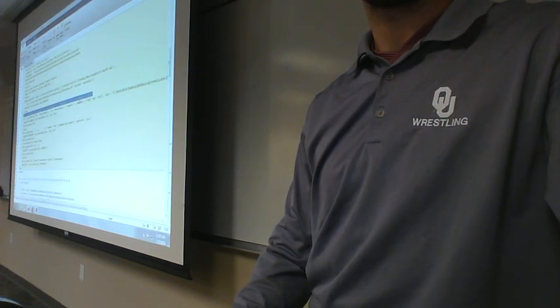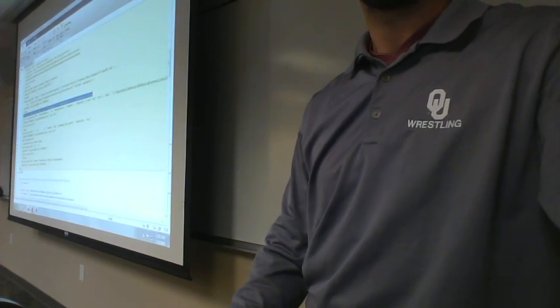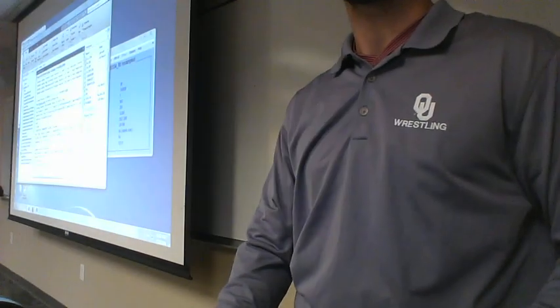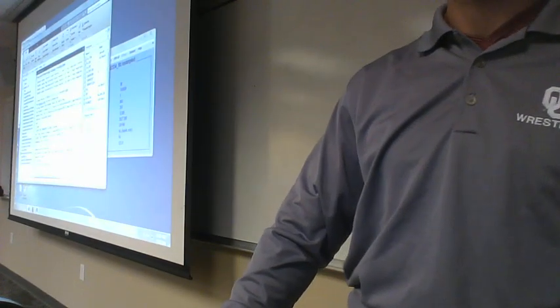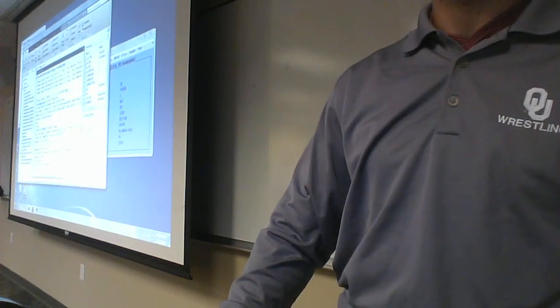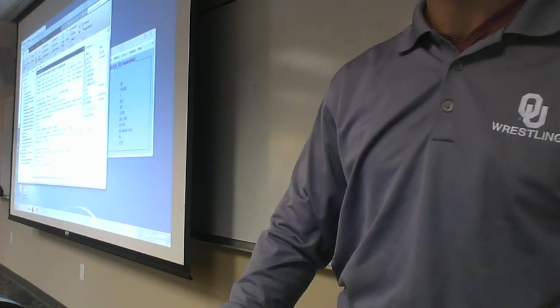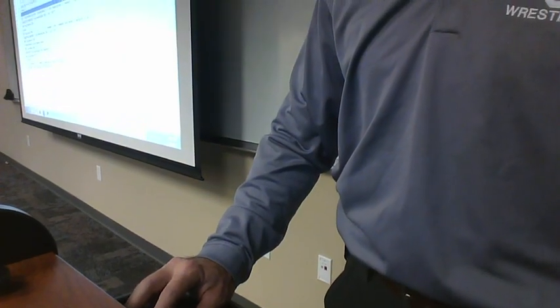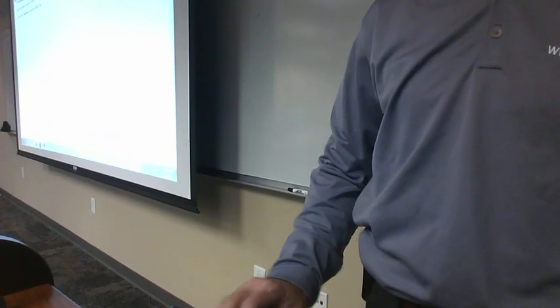I'm going to do this. One thing that I'm going to do is, so we have some events that I'm going to try to take out.